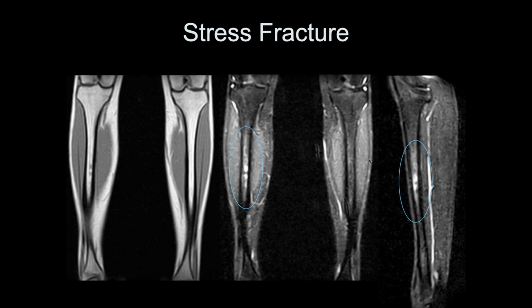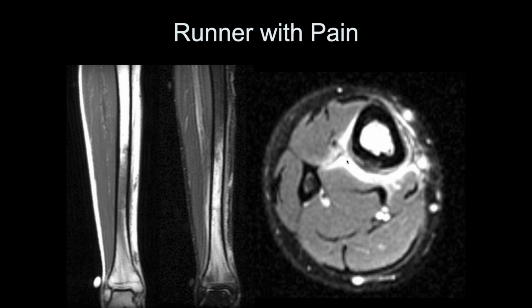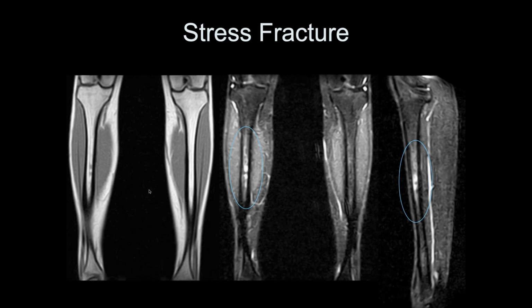These are stress fractures, but in the parlance of the runner, these are called shin splints. And you often will get edema around the bone, which we can see here, often anteriorly, like we saw in that much more subtle case before. But in more severe cases, you can get this extensive trabecular bone injury as well, which we can see here as signal loss, fat signal loss on the T1 weighted images.